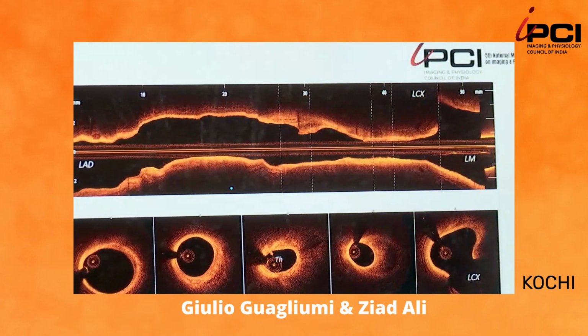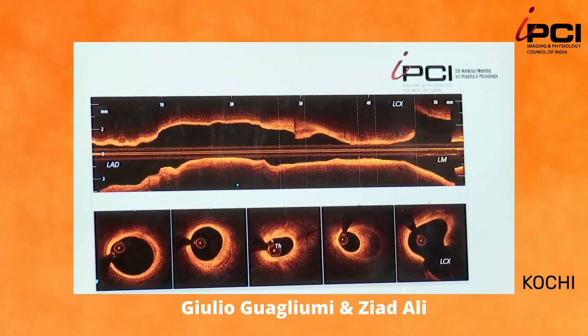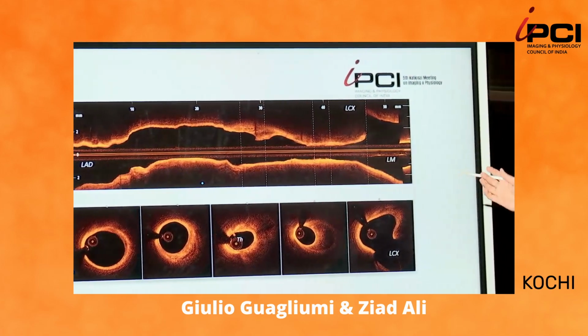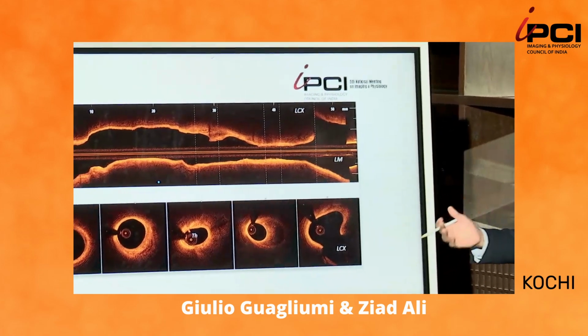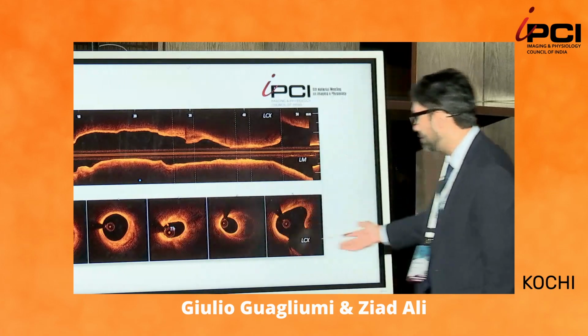What to get from this longitudinal view and a cross-sectional view? Well, I love this because it's real life, right? So I give a lecture on OCT, artificial intelligence, which reminds us that we need artificial intelligence because while MLD Max in its glory is very simple, real life is complicated. And this is the type of lesion that you get, right?